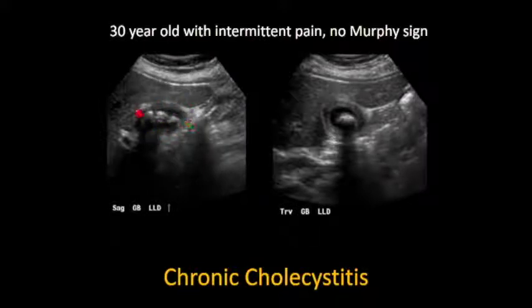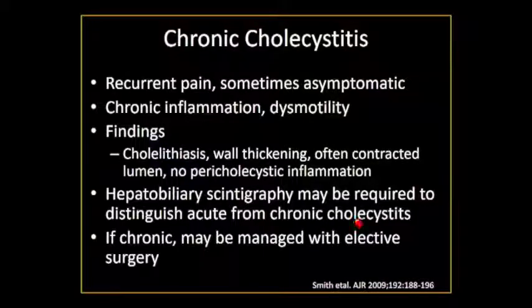but came in anyway, and the gallbladder looks like this in sagittal and transverse. This is not a distended gallbladder. It is not a tensile gallbladder. It is clearly abnormal. There are stones and there's wall thickening, and this is more representative of chronic cholecystitis and unlikely needs an admission at that time. So typically, the issue here is that the gallbladder is not that distended.